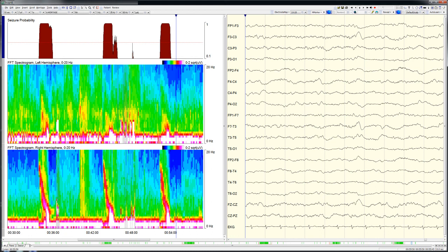Stereotyped trending patterns are usually present during a particular patient's seizures, and once recognized, these similar patterns make identification of most subsequent seizures a quick task. Relatively stereotyped ictal trending patterns occur because a particular patient's ictal EEG patterns usually bear strong similarities from one seizure to another. These features make the FFT spectrogram a useful tool for seizure hunting during review of lengthy EEG recordings.